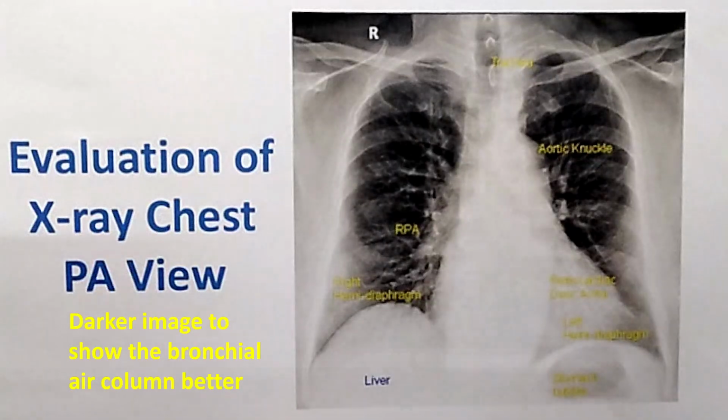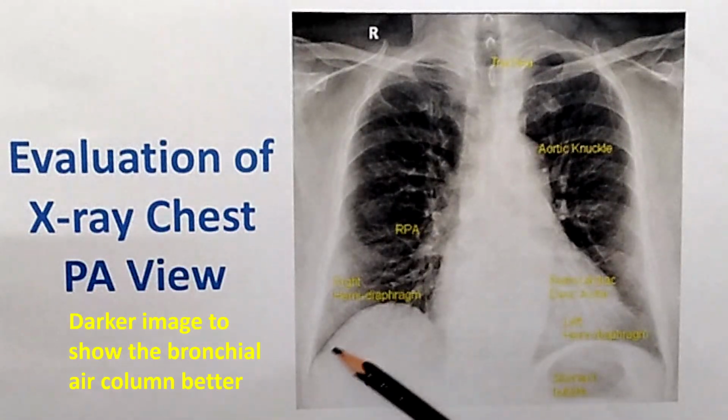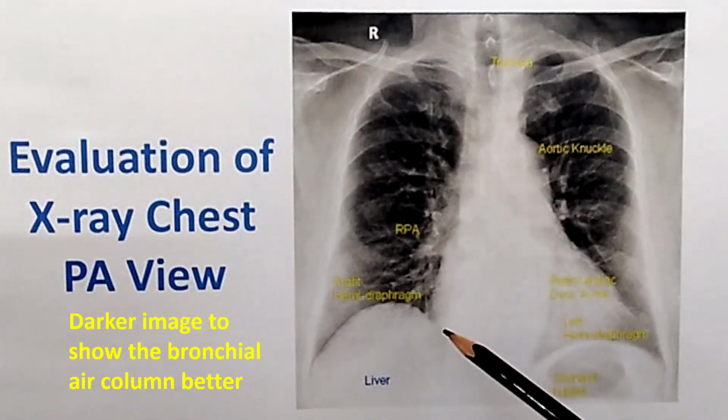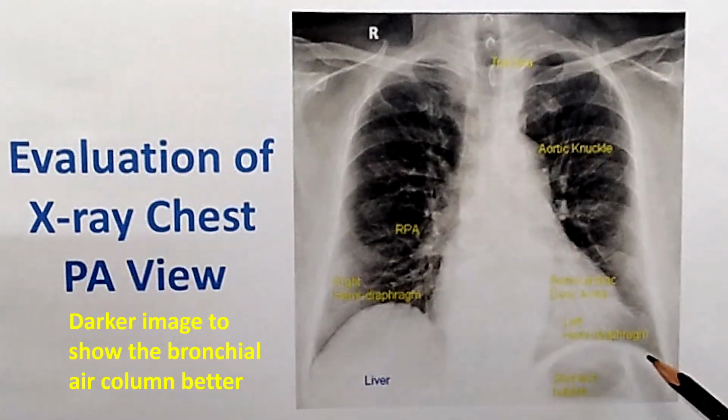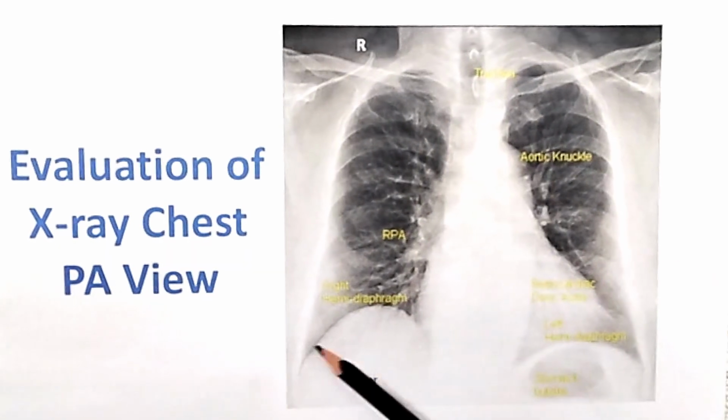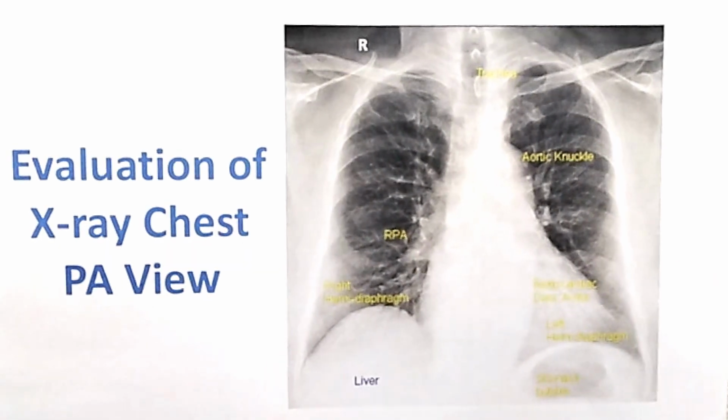Some cases, cervical rib can present with symptoms similar to cardiac pain because of the root pain. There are differentiating features, and you always look at the cardiophrenic angles and costophrenic angles. This is the cardiophrenic angle, this is the costophrenic angle. Small pleural effusion may be visible as just obliteration of the costophrenic angles.